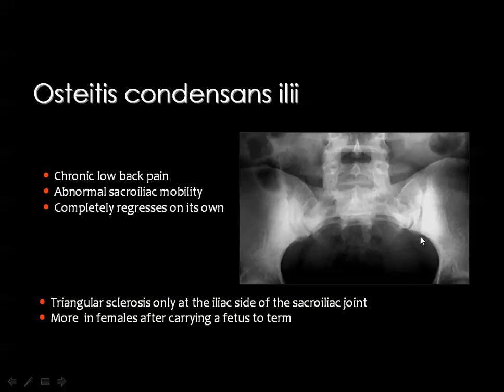There are no articular abnormalities, and this abnormality is commonly seen in females after giving birth to many children, for example, and this is a stress manifestation in the iliac side of the sacroiliac joint.